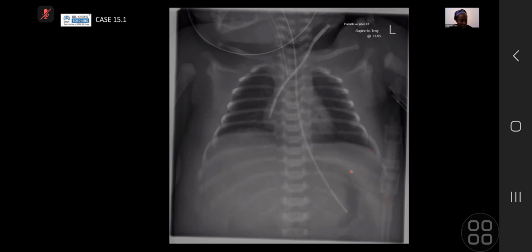As candidate 3 said, there is this rounded lucency over the visualized abdomen. What this radiograph is showing you, if you ever get presented it in an exam, is that initially you think it's a chest radiograph, I need to focus on the chest. But don't forget to look outside of the chest and at the periphery of the film, because the abnormality might actually be there. This is a football sign, incompletely imaged because we don't have the whole abdomen on, but this is seen in pneumoperitoneum.